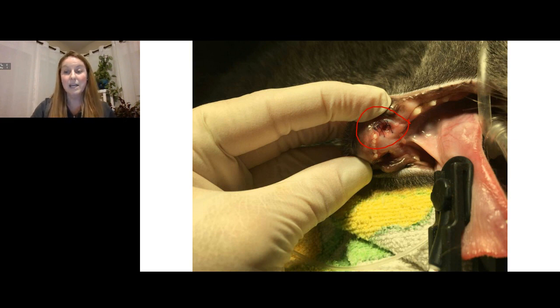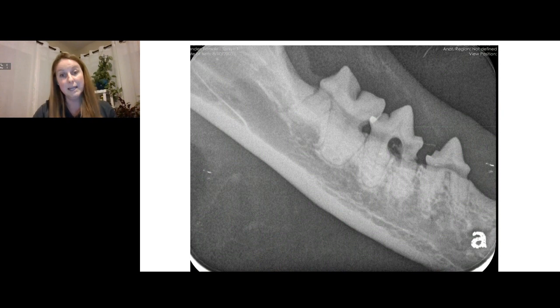When you see those mandibular swellings, those rostromandibular swellings in your cats, it does not automatically mean that it's something really, really bad. This is tooth resorption in a cat. We have type 2 here, where we have narrowing or disappearance of that periodontal ligament space in at least some capacity. We have type 1. So we are going to treat those teeth differently, making sure that we're identifying that, right?